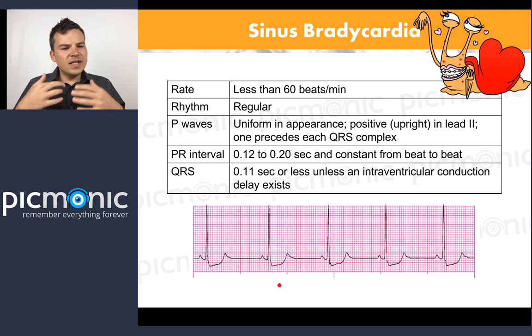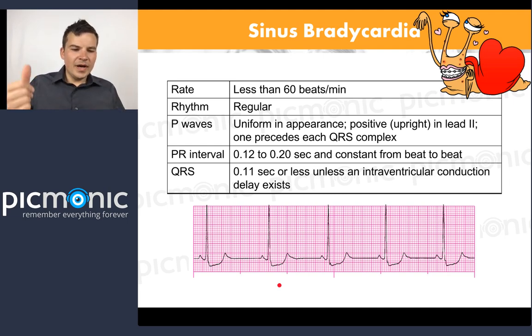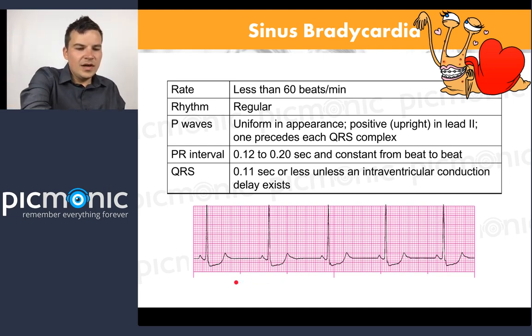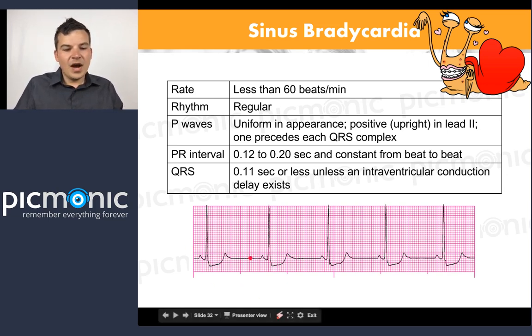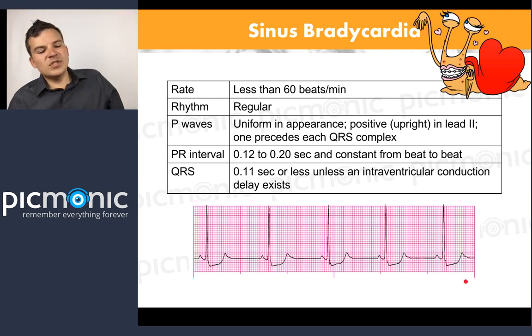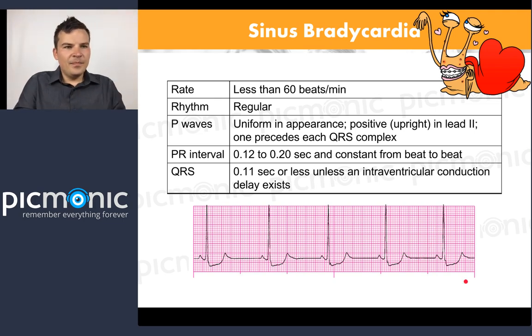Now, is the rhythm regular? Look all the way, my R to R's, yes. I look at my P to P's, P to P to P, all the way across. Beautiful. Very consistent. Is there one P wave? P, QRST, PQRST, PQRST, PQRST. Yes, beautiful.